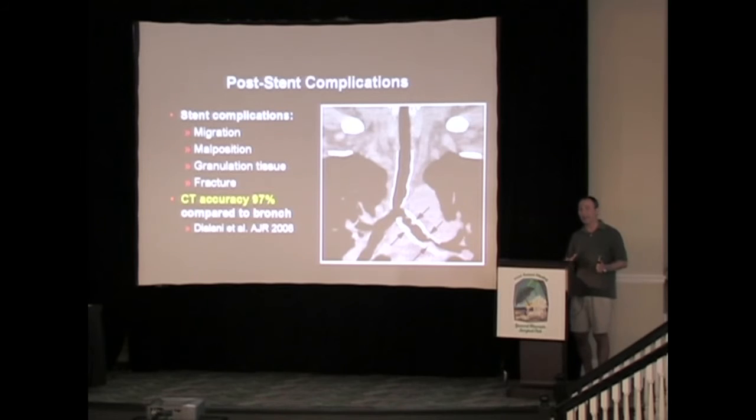One can evaluate any type of stent with CT. We heard a lot about esophageal stenting today. Certainly aortic stent grafts can be assessed. One of the areas where stents have had a lot of complications, although they do provide a lot of palliative improvement, is in the airways.